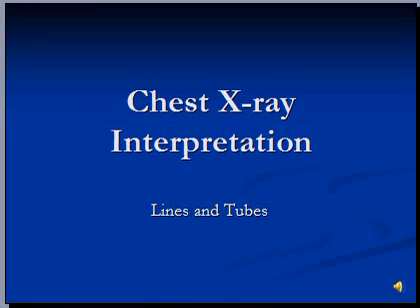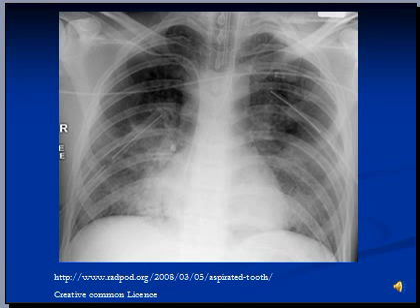If you are a treating physician, you will often need to check positions of several tubes on chest x-rays. If you are a radiologist, you will often have to describe positions of these tubes on your reports, along with other pathologies that you may see on a chest x-ray.